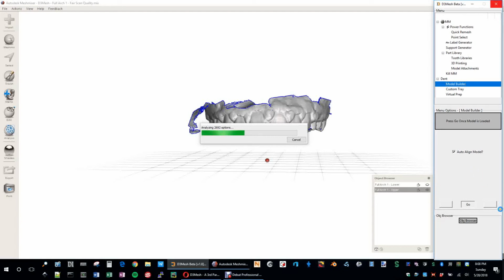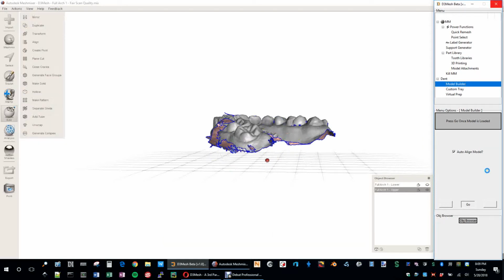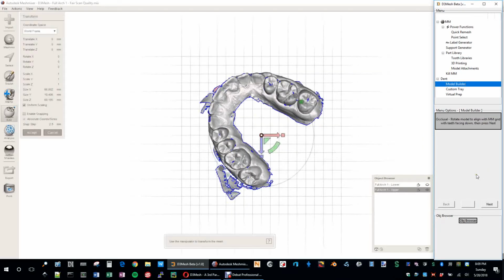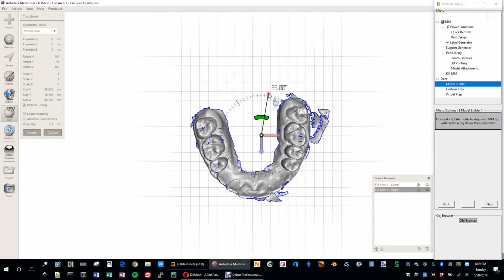As this goes through its 2,700 options, I'll just say that it's so remarkable what this program can actually do. It's seriously on par, if not more comprehensive and more flexible than some of the most expensive dental CAD softwares out there. And I'm not even joking. It just has all the basics, and you just have to put it together. So instead of reinventing the wheel, we'll just use what's there and piece it together ourselves for a much cheaper price point.